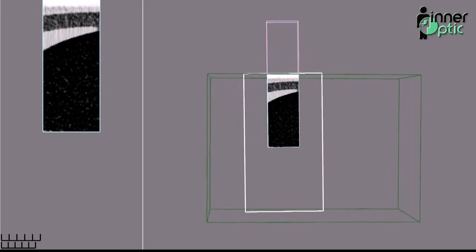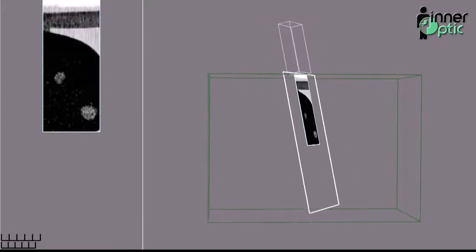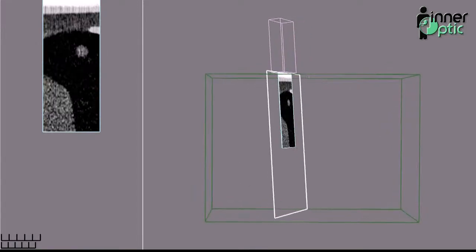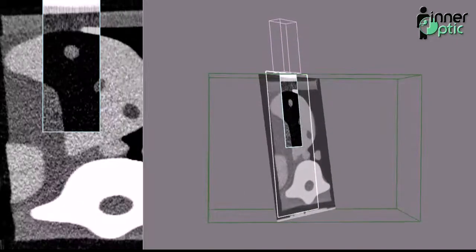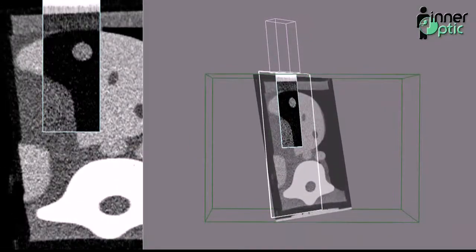Spotlight, an intraoperative stereoscopic visualization. Here we can see a motion-tracked ultrasound transducer. The pink box is the rudimentary version of the housing. Underneath it we see a simulated live ultrasound scan. We can also draw a plane of the preoperative CT, which is coplanar to the ultrasound scan. So I can navigate the preoperative scan using the ultrasound probe in the sterile field.